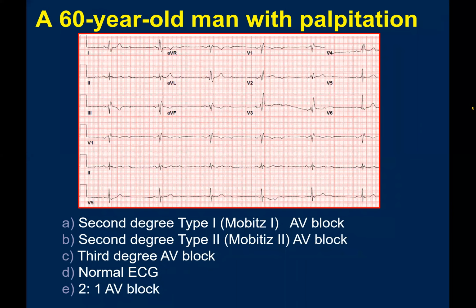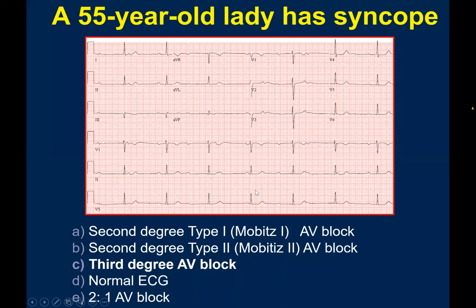Excellent. So basically, as you started, the patient is bradycardic. That's why if you start with the rate and regularity, it can be very helpful in the diagnosis. So the patient is bradycardic, and clearly, as you mentioned, we have to be sure what is the cause of that.